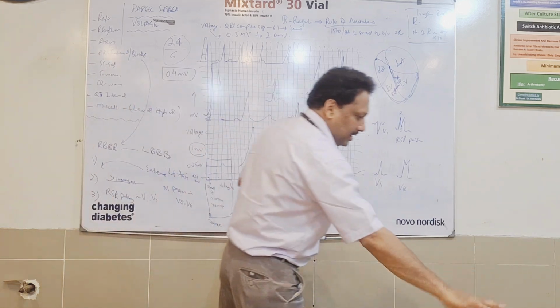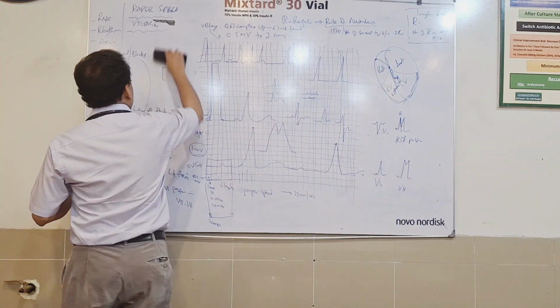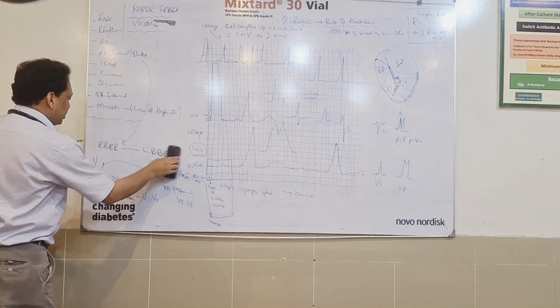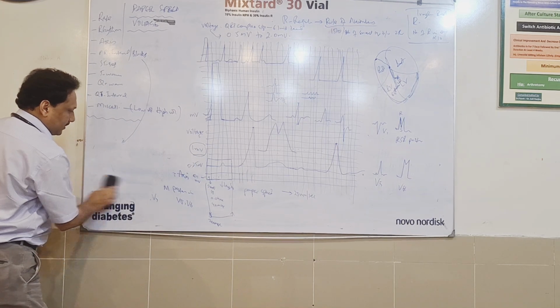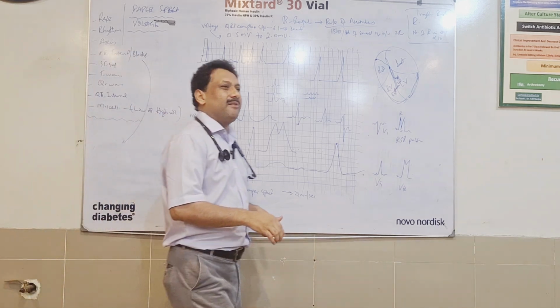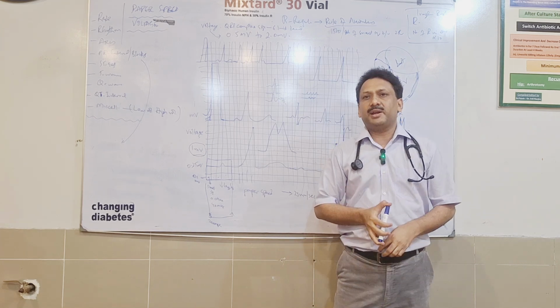What next? Next is, as we studied the voltage, now I just wanted to tell you about the calculation of this voltage in relation to the ventricular hypertrophy criteria.